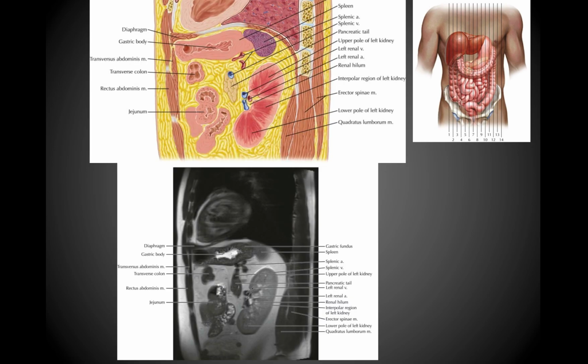Moving further to the right now from the previous image, we can see more of the stomach next to the spleen, much more of the kidney, including the hilum. So you can see the vasculature moving into it, the artery, and then two of the renal veins. And then we see parts of the small intestine showing up, as well as the transverse colon, and as I mentioned before, part of the stomach next to the spleen in this individual. And just above all those structures you're seeing right here is the heart with the diaphragm right below that.